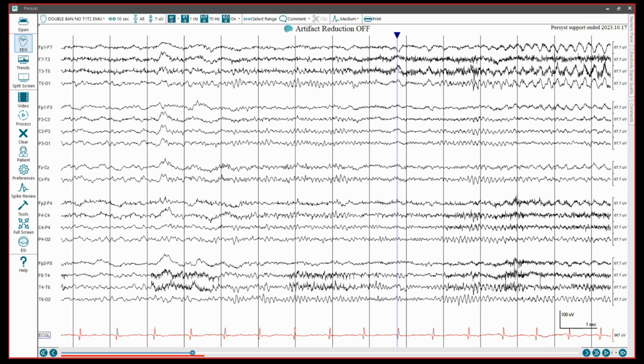So the difference between sharp waves and spike waves is this. Spike waves are spikier. They have a duration from between 20 to 70 milliseconds, while sharp wave discharges have a duration from between 70 to 200 milliseconds. They're all equally epileptiform. It's just more defining the nuances of their morphology. So it's still within the perimeter of what would be considered an epileptiform discharge.